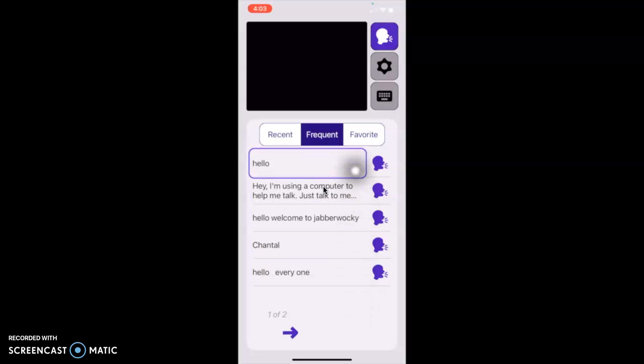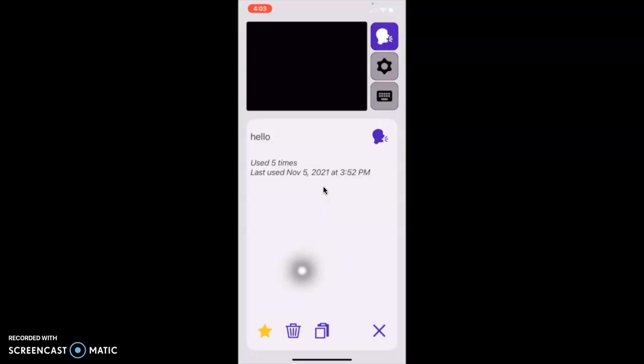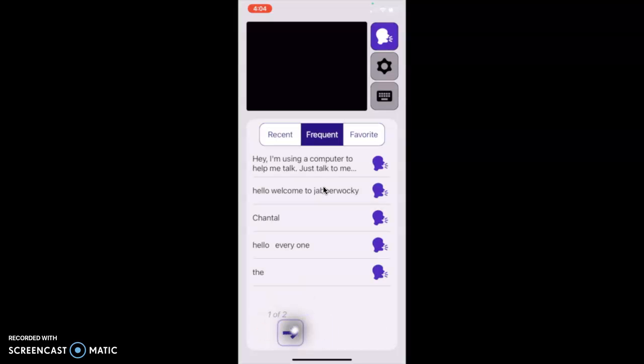Once you click on one of your statements, it will provide you with options of what you can do with it. So you can favorite them, delete them, copy them to your speech board, and then exit out of them, or you can also play it out loud. So with this one here, I'm going to delete it just to show you how to do it. And then as you can see, it removes it from your frequent section. So next we're going to move on to recents.